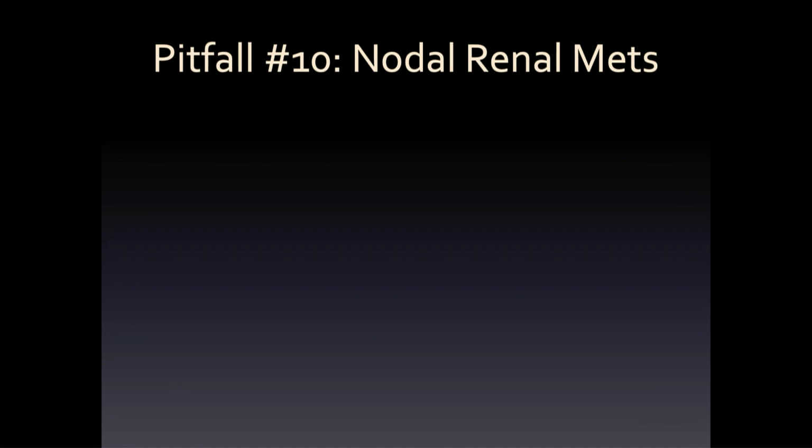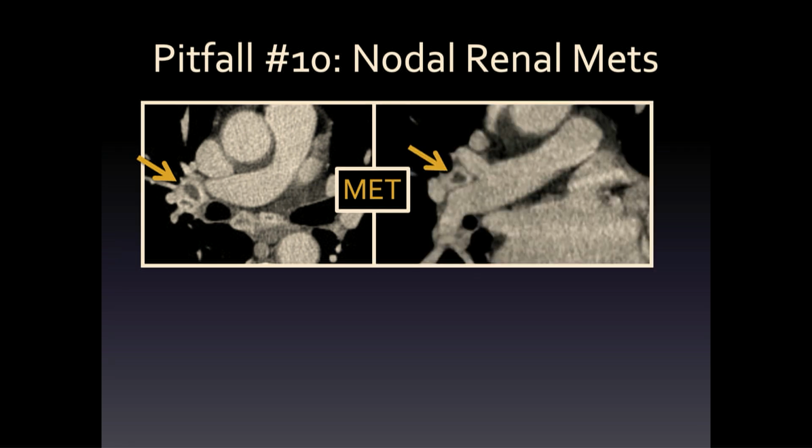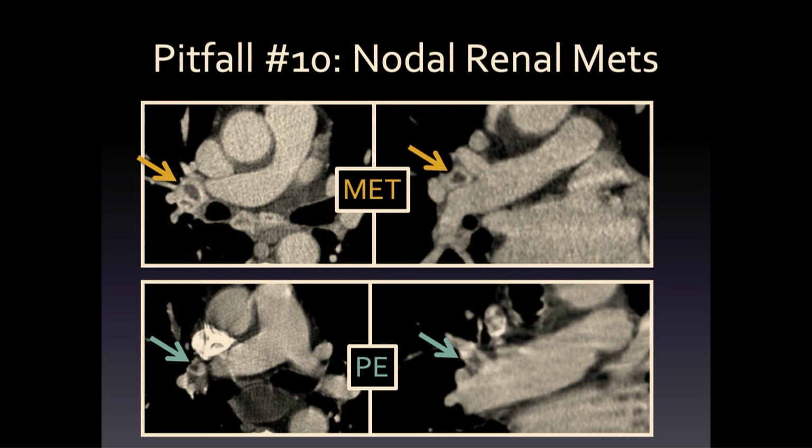Particularly renal is classic at this. Tumors on the outside, tons of blood flow, really intense contrast enhancement, and a dead smooth center. I don't know why it looks like this, but that's what happens, and it can really trick you. Here you can see a necrotic lymph node in the arch, or in the crotch of two vessels coming together, whereas here is a PE actually in the vessel in the same location. That's real.